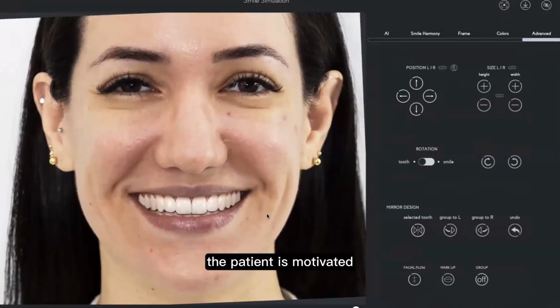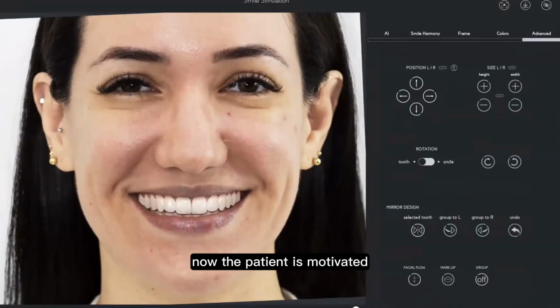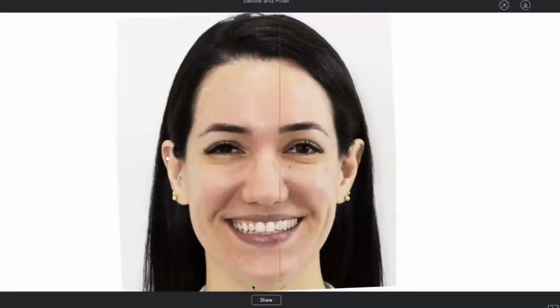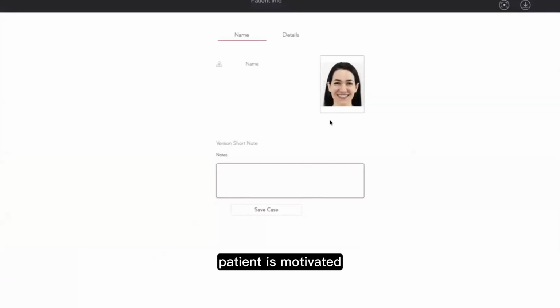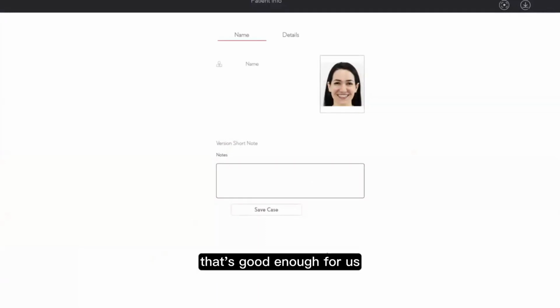The patient is motivated. I spend 1, 2, 3 minutes in a discussion with the patient to show the advantage of an aesthetic treatment. Now the patient is motivated. I can share the picture before and after with my patient by just clicking on the slider. And then I can also show my patient the before and after picture, and that's it. The patient is motivated and wants to know more about the aesthetic treatment. That's good enough for us.